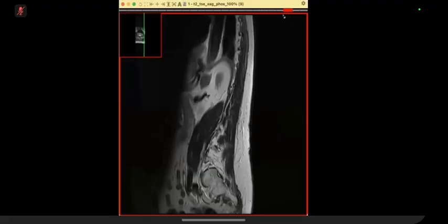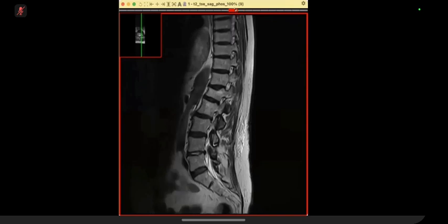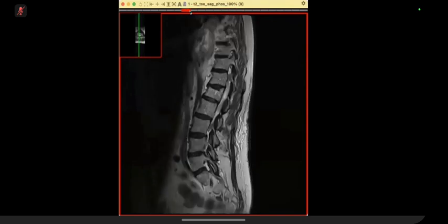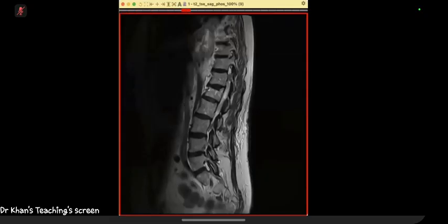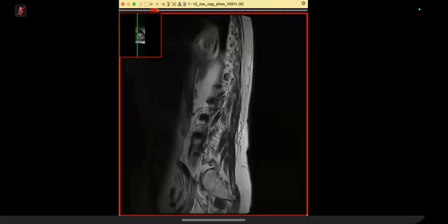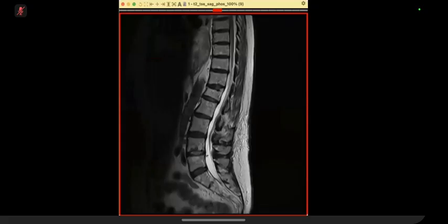The pars interarticularis, I couldn't see any defect within. Now here in this disc space, there is a wedging again, which is redemonstrated. So the main pathology here is the abnormal L4, L5 intervertebral disc showing an abnormal signal along with abnormality affecting the inferior end plate of L4, associated also with a disc bulge encroaching mainly in the left neural exit foramen.